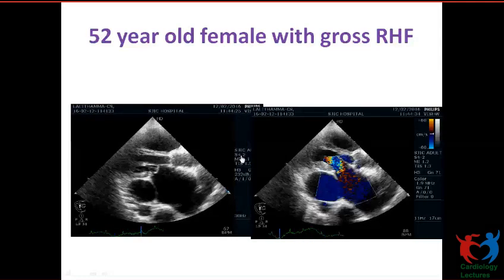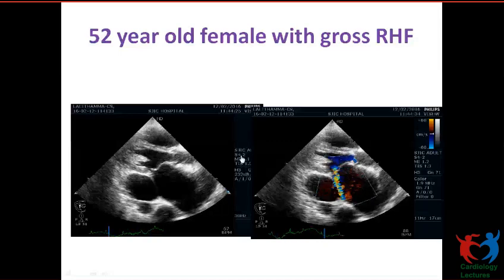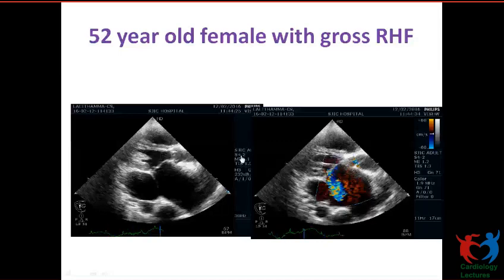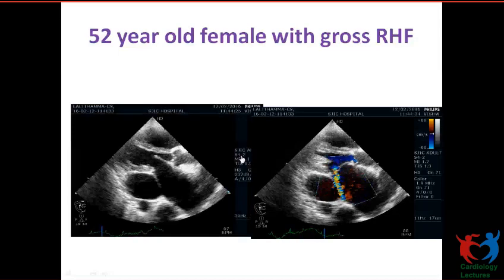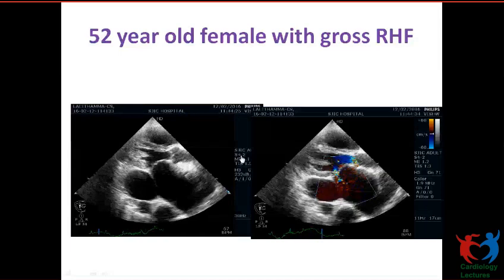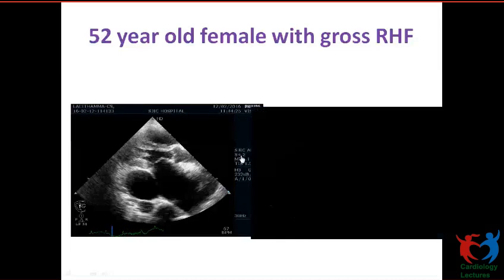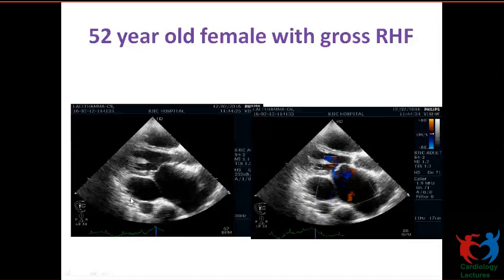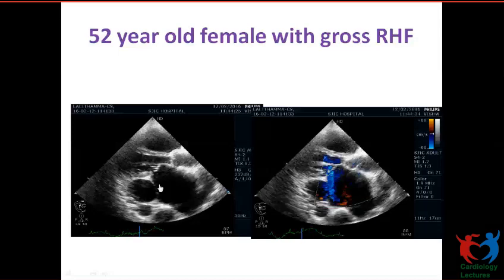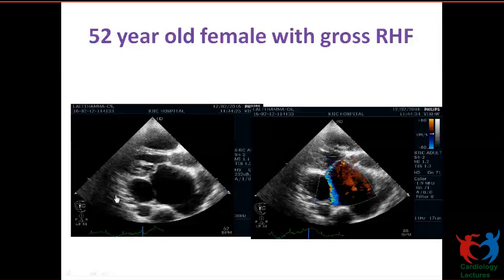What is this view? See, when you're asked, go systematic. Parasternal long axis view with CS dilatation. It's written there, unfortunately. So, what is this? Cystic mass, hugely dilated. Don't jump here to give the differential diagnosis. What all can come in this region?